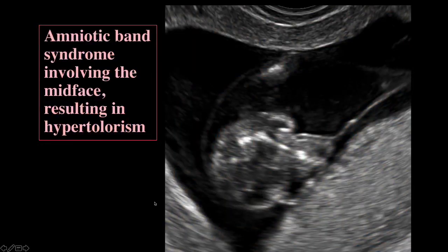Okay, moving on to amniotic bands. Amniotic bands can involve the face, and when it does, it's devastating because the band just sort of slashes across the face. You can see an example here of amniotic bands. You can see the band coming in here onto the face. It caused a big gash in the middle.